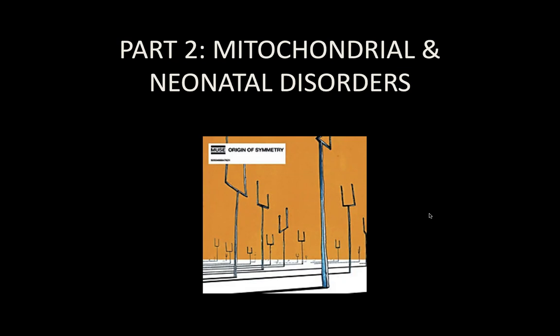Because when you see something bilateral and symmetrical in the brain, you need to think neurogenetic, neurometabolic, although other etiopathogenetic factors may be involved, like for instance toxicity or drug-related neurological damage. But as a general rule, when you see symmetry, consider, please, abnormality in the realm of neurogenetic, neurometabolic disorders.